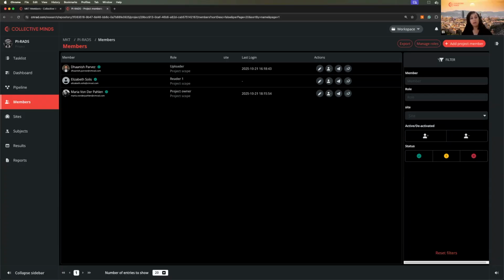Okay, so as Maria mentioned, we have an audit log and we keep track of all the things that we do inside of it. So we already had all this information, when the members were invited, when they were approved, but you had to go digging, and you had to know where you were digging. You had to go to the audit log and know, for example, the name of the event that is recorded. You could go and look, and you had to use the filters.